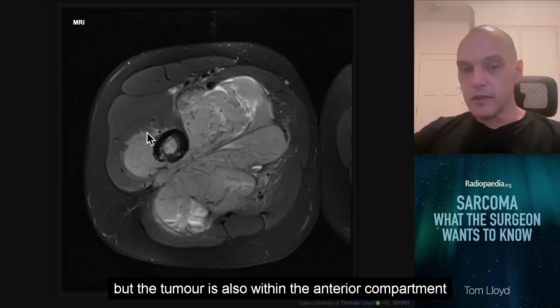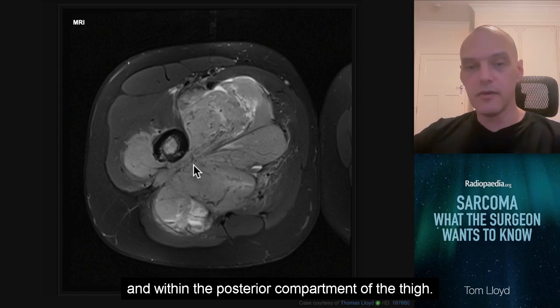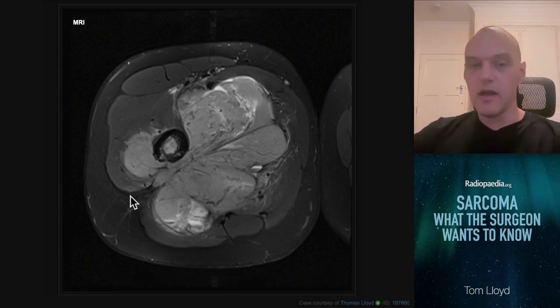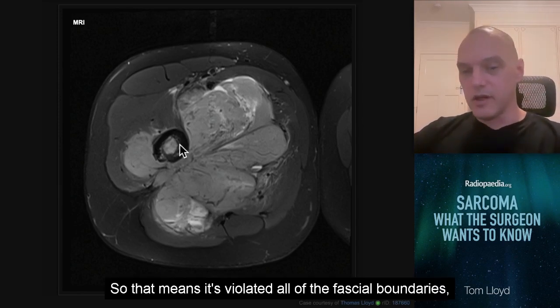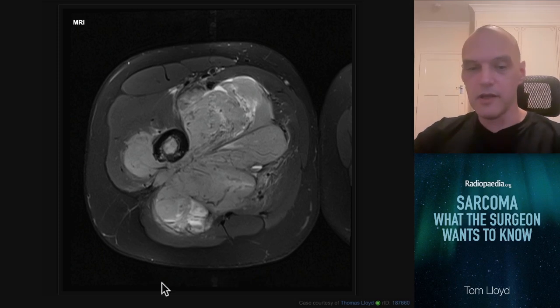But the tumour is also within the anterior compartment of the thigh, within the medial compartment of the thigh, and within the posterior compartment of the thigh. So that means it's violated all of the fascial boundaries, and it's gone into all of the compartments.